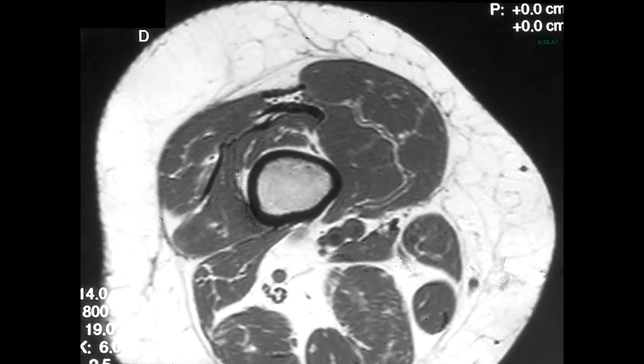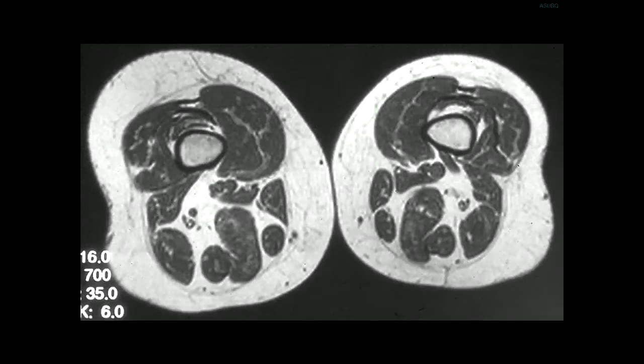T1 and axial T1 and fluid-sensitive sequences were done, which really didn't show a mass. Now, in general, I don't like to get the contralateral side because most of the time it really is of no value. But when a patient comes in with mass-like symptoms and I don't see a mass, I always like to get the contralateral side for comparison. And if you look at that in this case, you can see the overgrowth of adipose tissue, which was why the patient was presenting for evaluation.